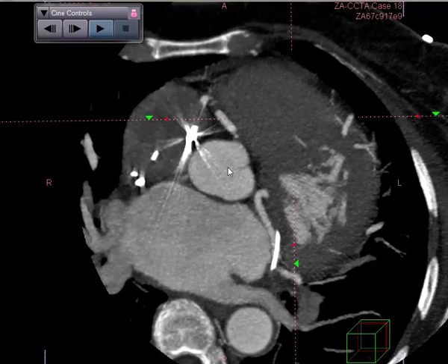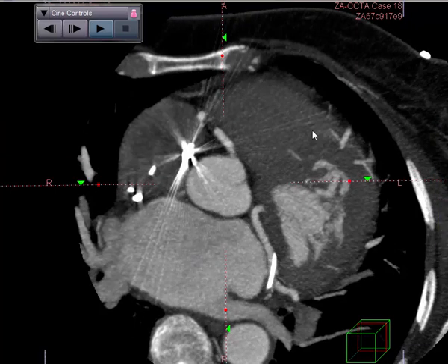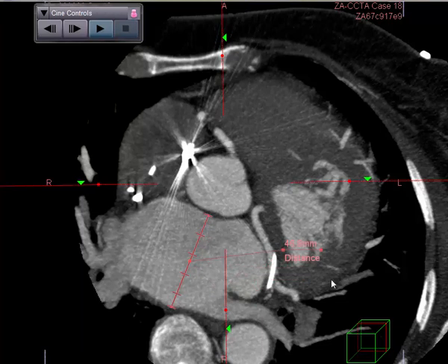If we move this up to the center here, we can get a general idea of looking at the left atrium. If we pretend to be an M-mode echo, we can then do two-dimensional measurements approximately in this area, and get an estimation of the overall size, getting about 46, 47 millimeters. Upper limits of normal is about 40 millimeters. So this is mildly to moderately dilated.